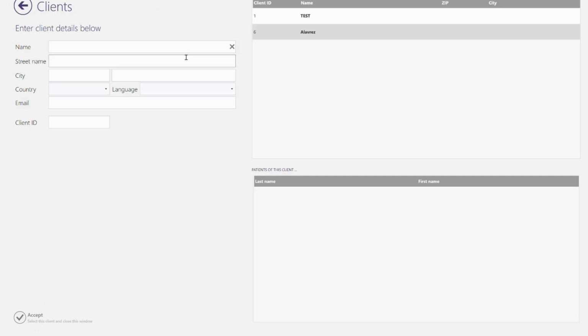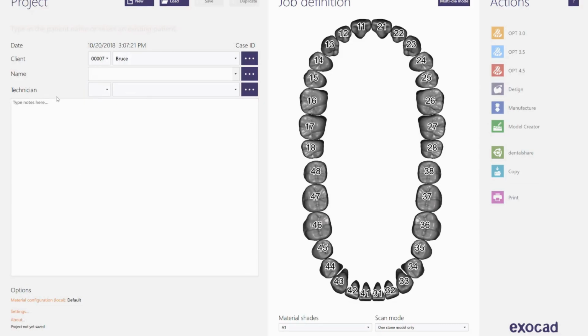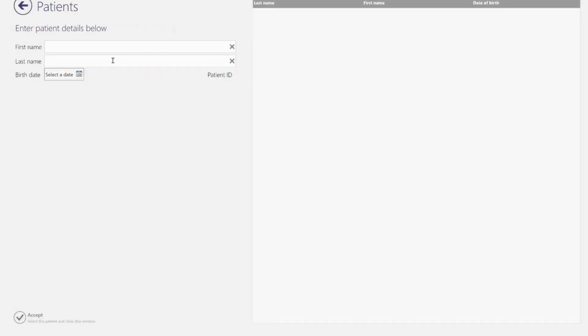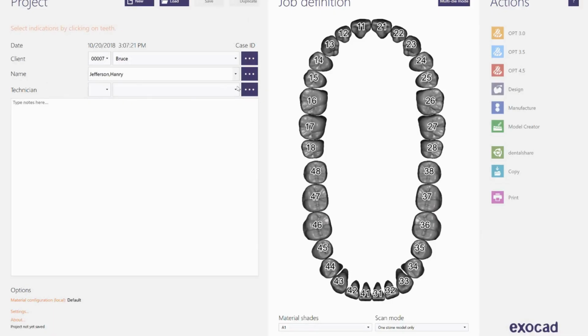So with that said, I will start creating this new project. I'm going to create a new customer, whose name is Bruce. It's just an example. Again, guys, I don't want to fill in all of this. Street and city you can do by yourself, and then the name of the patient could be, let's say, Henry, last name Jefferson. Click new, it's right up here. Then I'm going to set the technician, which is me.